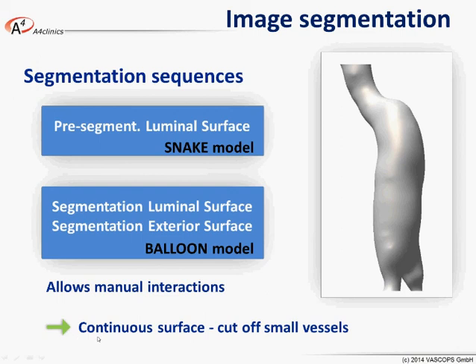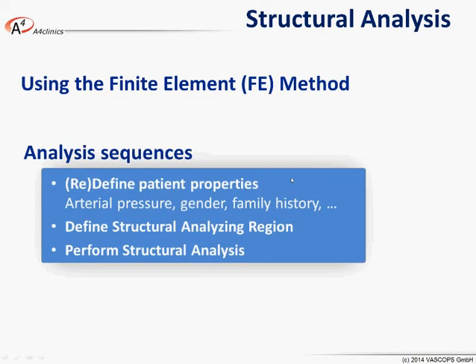Most important though is that it cuts off small vessels and always produces a smooth surface, which is very important in order to not end up with stress artifacts in your finite element simulation later on.